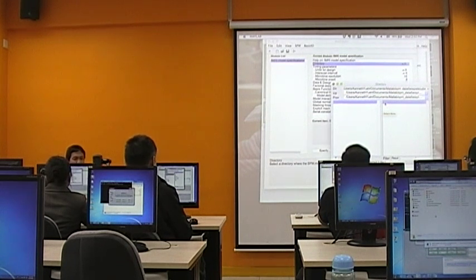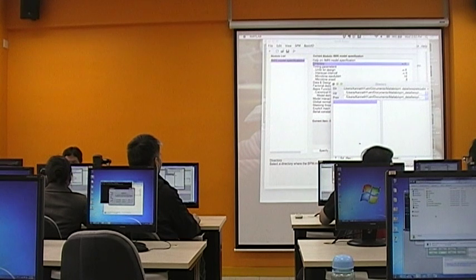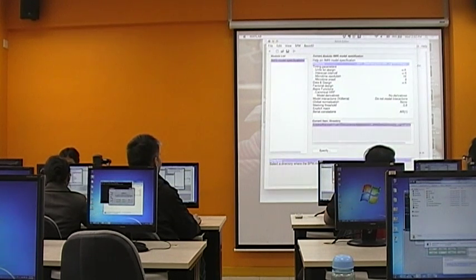One dot is like the Linux command for the current directory. So you simply click the dot, and you could always double check by looking at the bottom to see if you have something like a selected file. Okay? And you click done, and here you already see the directory you selected.